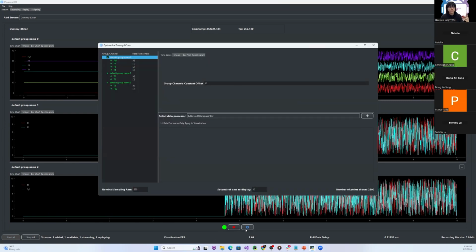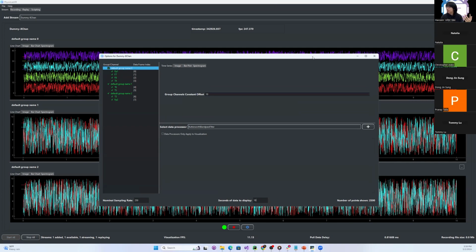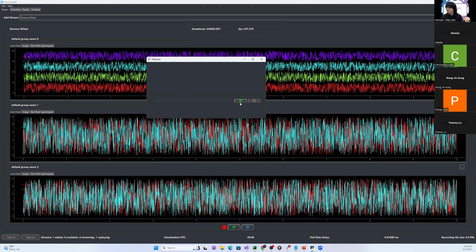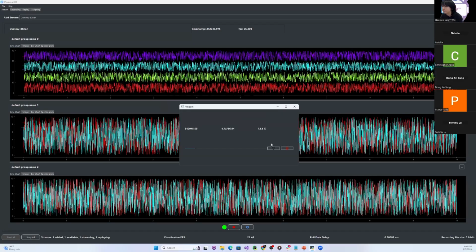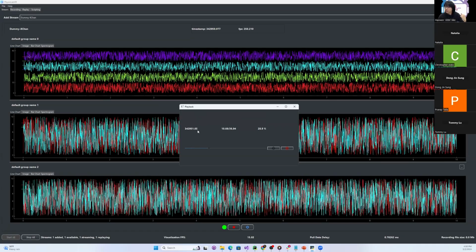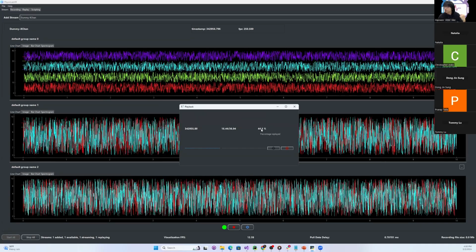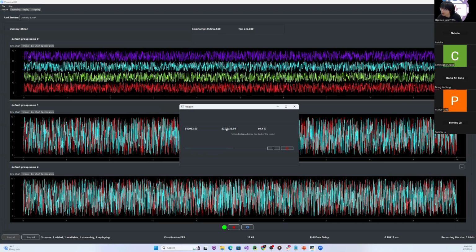So at this point, we just replayed the recorded streams from the simulated EEG source. Oh, so that stopped, and by clicking this button, we can start over the replay server. And in the playback window, you can see the timestamp from the local clock and the percentage of the replay and the seconds elapsed since the start of the replay.